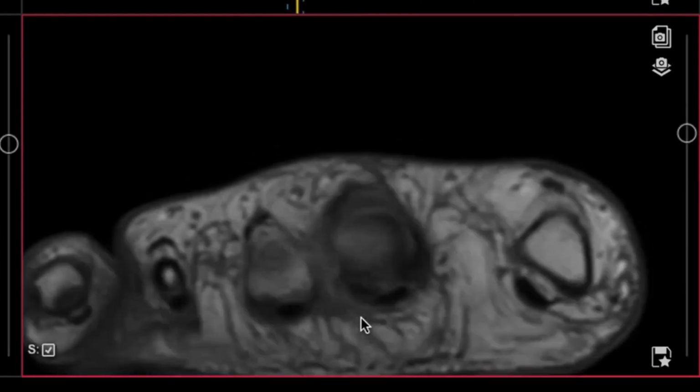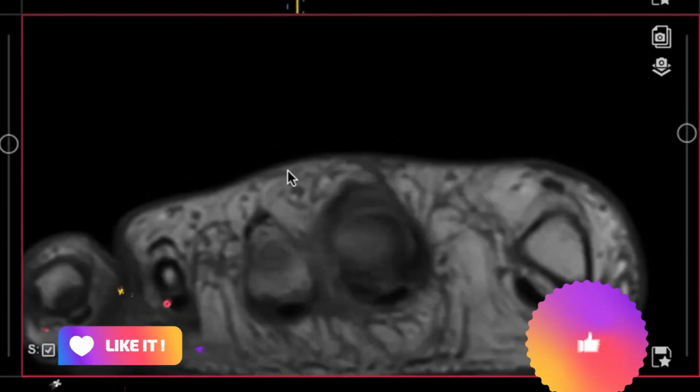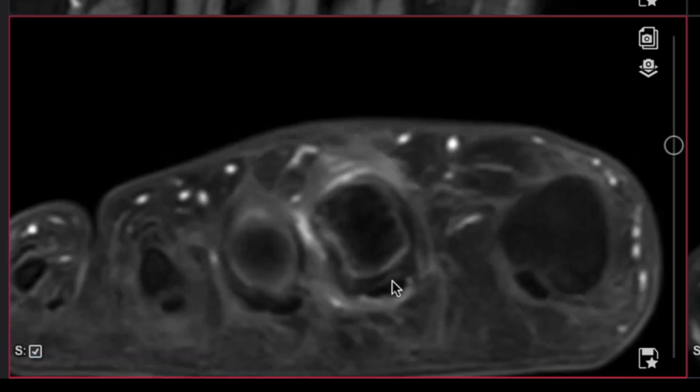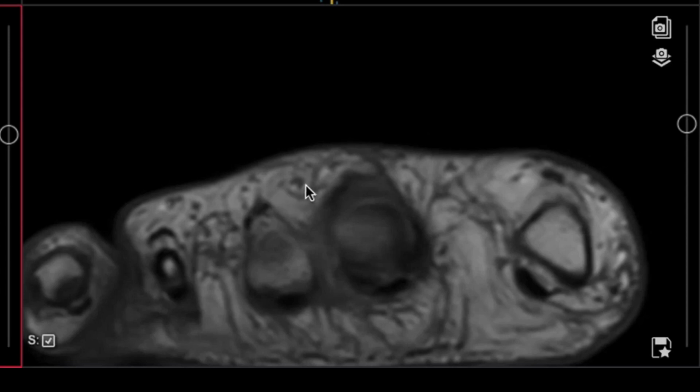And it has been found to guide you in assessing whether or not this is a lesion associated with the plantar plate pathology, that you would construct and bisect a line. And if a portion of the neuroma or pseudoneuroma lies closer to the plantar plate issue, this is considered perineural fibrosis, and the etiology of this neuroma is based on that plantar plate instability.